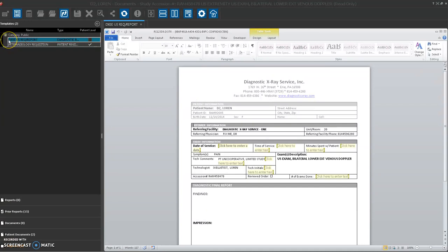And it'll say either DXSE, or if you're watching this and you're an RMX tech or a DXSB tech, then it'll say DXSB or RMX over here. So this is a tutorial for anybody, but based off of this one, it's just under DXSE. So whichever place you are located at, it's going to pull up the correct template over here with the correct header. All right, so from here, again, I clicked on templates.